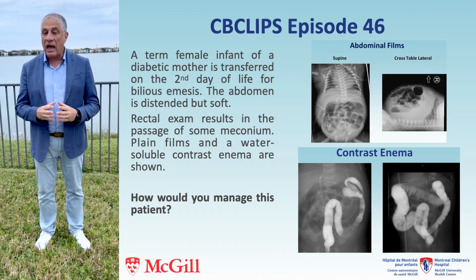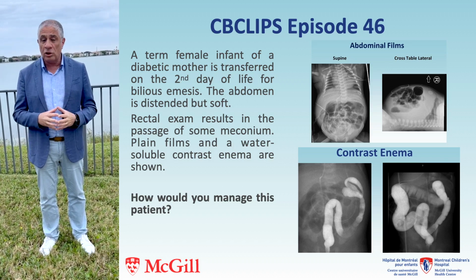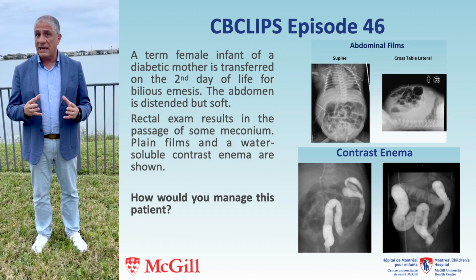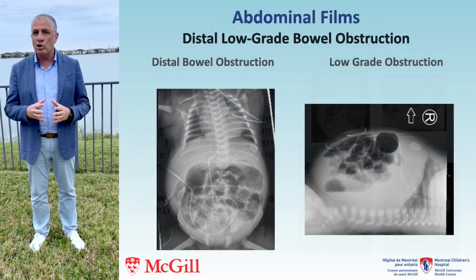In this episode, I present you with a scenario of a neonatal intestinal obstruction in a baby girl born to a diabetic mother. I show you the abdominal films and the contrast enema and I ask you, how would you manage this baby? Let's look at the films.